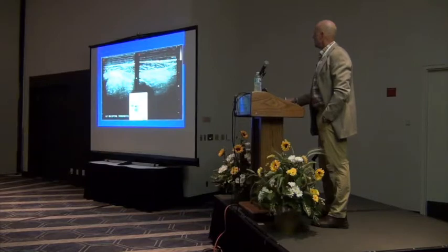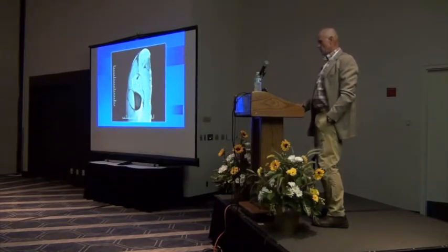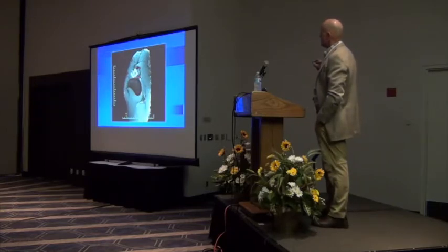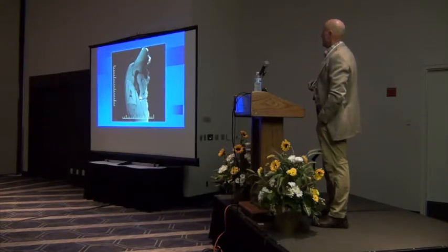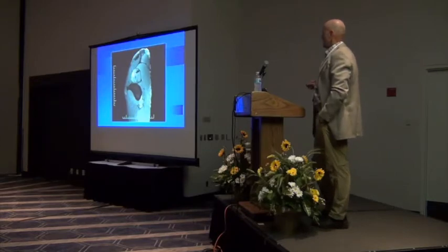So that was an enthesis change, and this was the one case that we've had the opportunity to do an MRI. This is the humerus. Here we come up. This is the musculotendinous junction. Now we get into the biceps. There's our lesion. Now what's neat is it'll flow through again. There's coming up to the supraglenoid tubercle and then this attachment. Now, as we go back, just one more time, look at the bone response underneath. And I think I have a still after this as well.